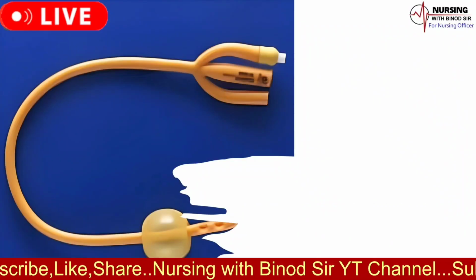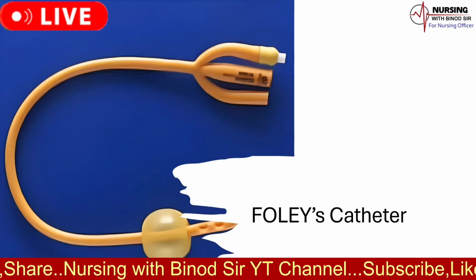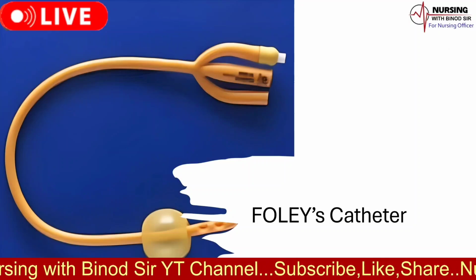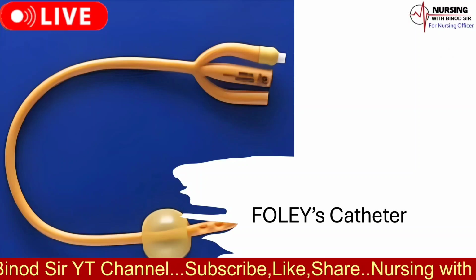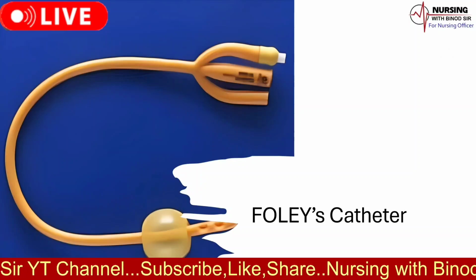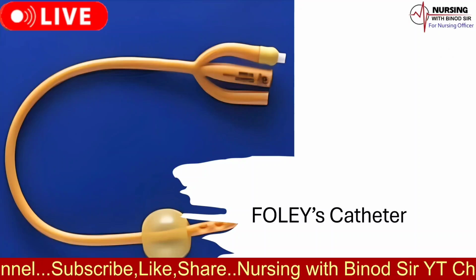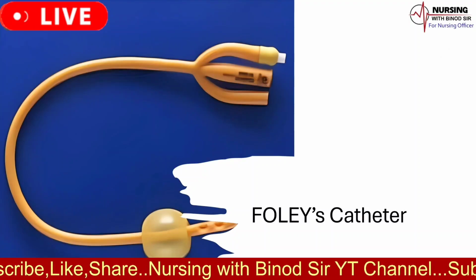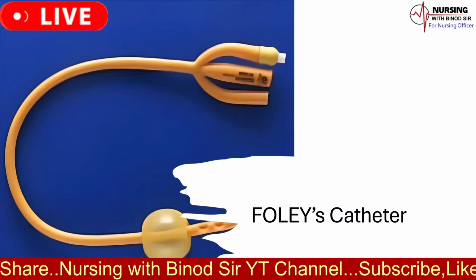The name of the catheter is Foley's catheter. Foley's catheter is used for continuous drainage of the bladder in cases with: 1. Eclampsia. 2. Retroverted gravid uterus. 3. To give rest to the bladder following any destructive operation, and or in a case with suspected bladder injury. It is usually kept for 7 to 10 days.